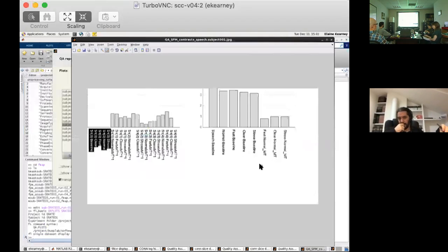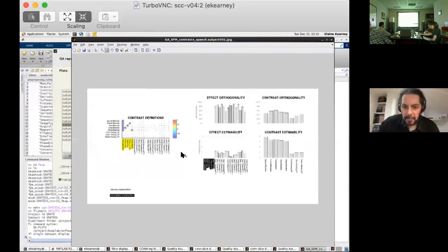And so we're getting rid of the effect of speech to a large degree, so you're going to be removing the ability to determine any difference between those conditions. But I don't know if that plays a role here. Let me see the orthogonality. It doesn't.